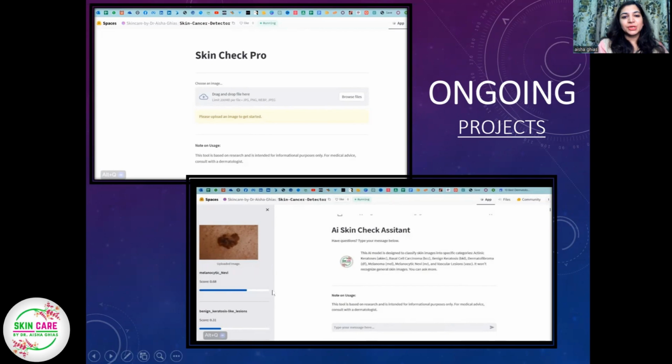Once you feed that picture into the system, it instantly comes up with its options of diagnosis. It takes maybe 1 or 2 seconds, and then it gives you the options, the diagnoses which AI thinks are pertinent to consider in this case.